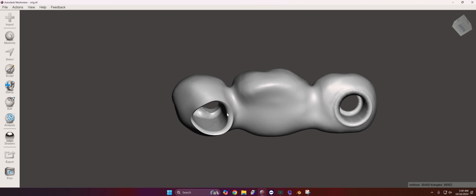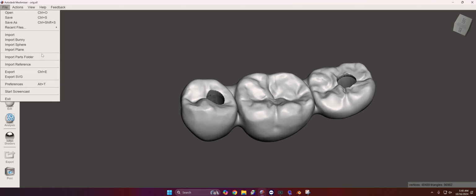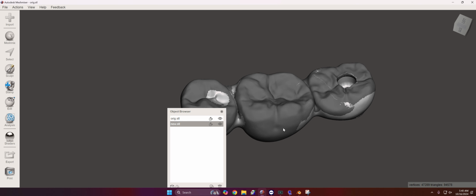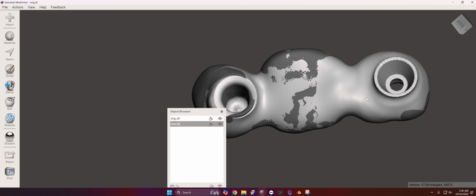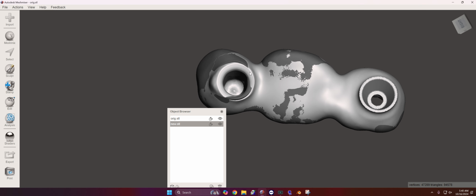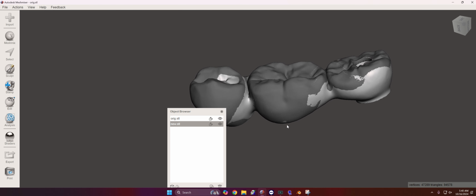Well, the abutment's already sent and I have this aspect of it, and this had a tie base in it, and I just started thinking, I don't like this. So what if I went ahead and redesigned this case? Let's import another object here for a new design, and you can see rather clearly that now I've designed it to go direct to the multi-unit back here, but when I do that inside 3Shape or most CAD programs, we're going to lose the abutment profile that is over here, and that's really frustrating, especially after you've sent an abutment to go get manufactured, and well, what do?